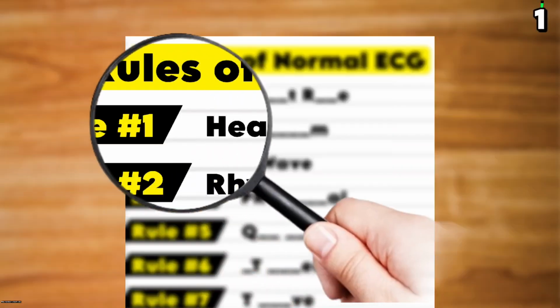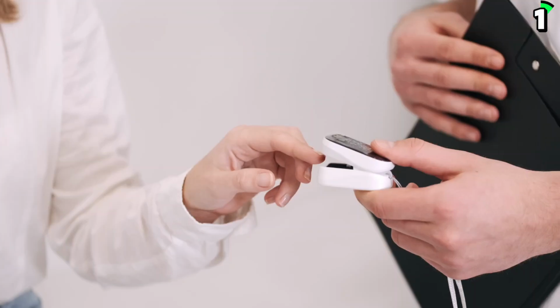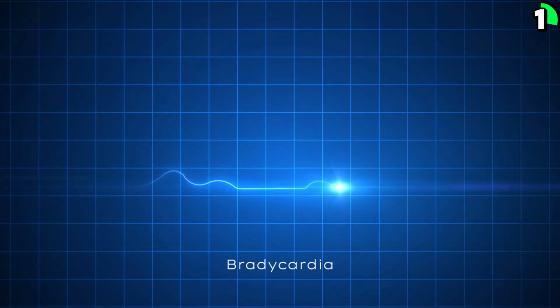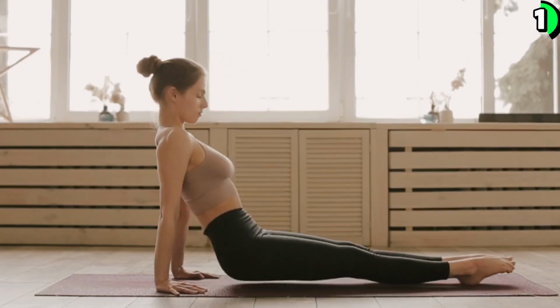Rule number 1. Heart rate. 60 to 100 beats per minute. The first thing you check, heart rate. A normal resting heart rate is between 60 and 100 beats per minute. Too slow? That's bradycardia. Too fast? That's tachycardia, unless the patient is stressed, in pain, or exercising.